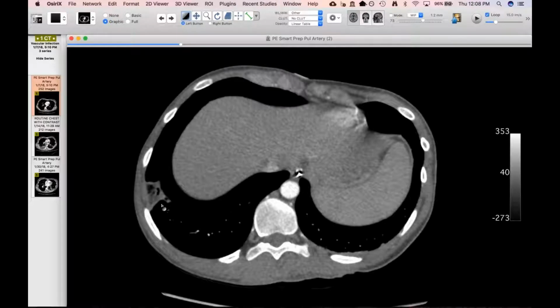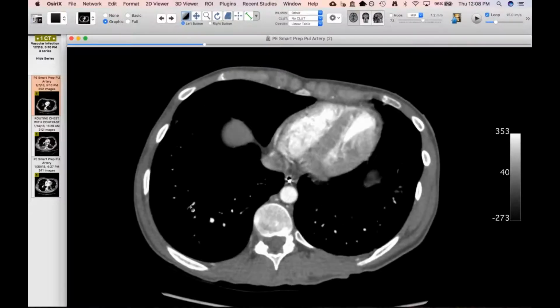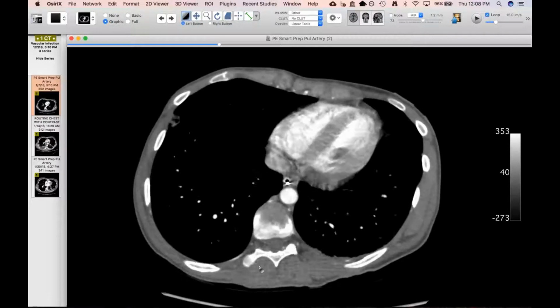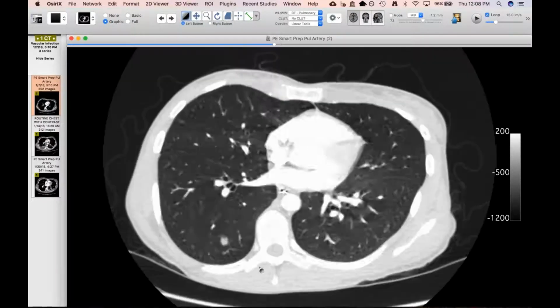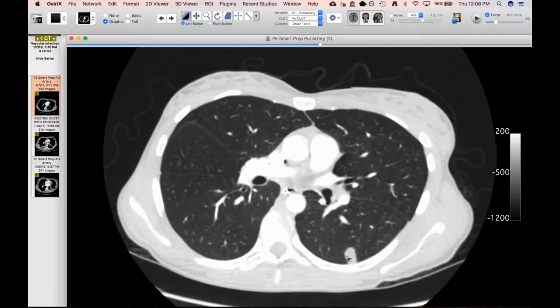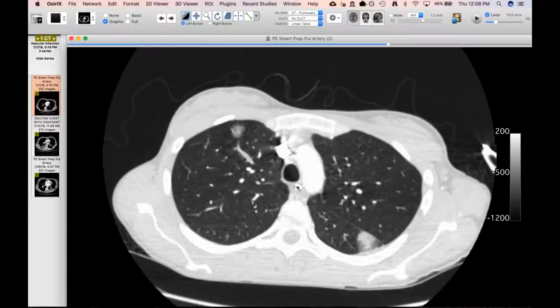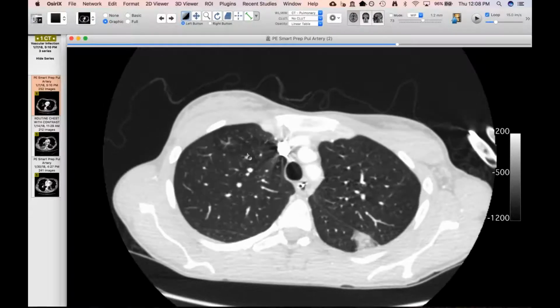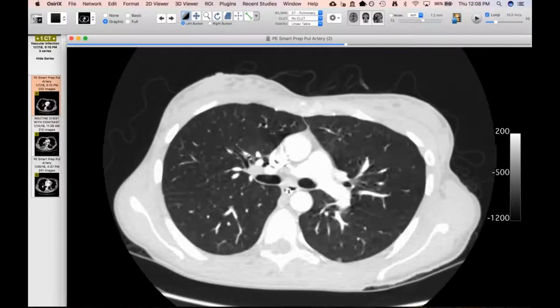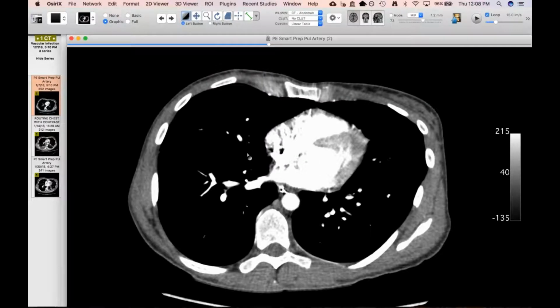But here you can see in her right lower lobe that she has a nice look of a peripheral infarct that's non-enhancing, and a couple of other little things too peripherally, and some little nodules. And on this study, earlier in January, you can see nice peripheral nodular foci of consolidation in the setting of bacteremia. Drug use certainly looks like and behaves like septic emboli.